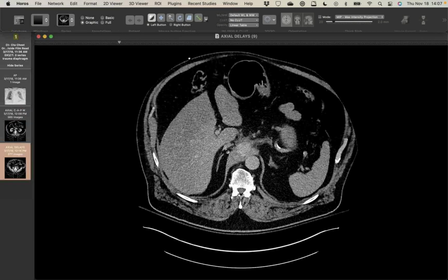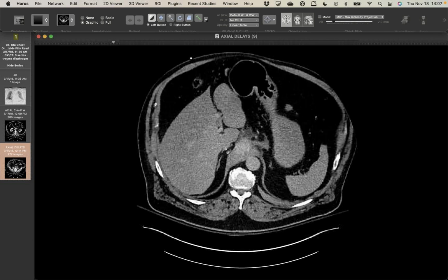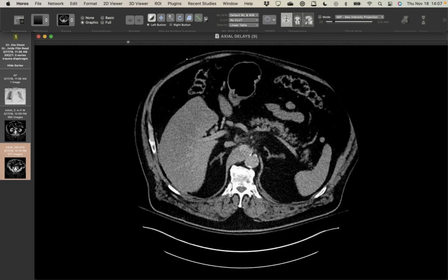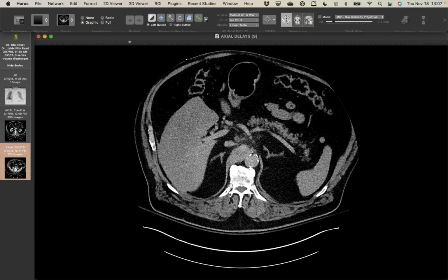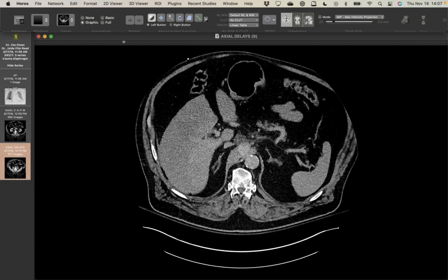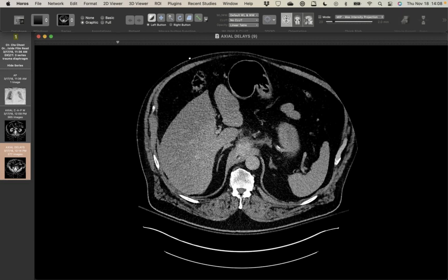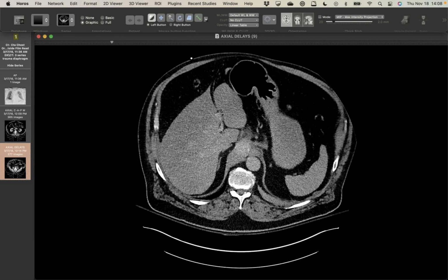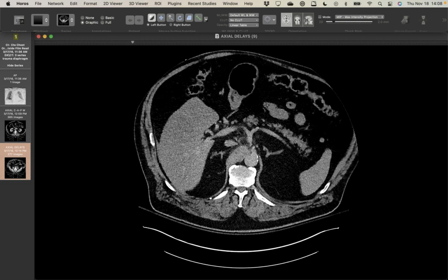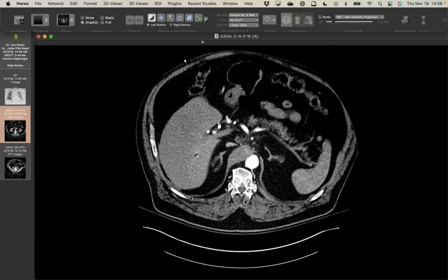They did some delayed imaging for the abdomen, so I pulled those, and you can see that the bleeding, you don't see it on that series, but a little bit of it's still there. They ended up doing some abdominal surgery for some minor bowel injuries. You can see a little stranding at the root of the mesentery there. They didn't repair this because it sort of was auto-tamponading itself, but I've now seen a few diaphragmatic hematomas. They always seem to form right at the crus, and the ones I've seen have always been associated with mesenteric injuries, and of course you'd have to worry about a pancreatic injury or any sort of vascular injury there, but I have not seen one before with active bleeding.